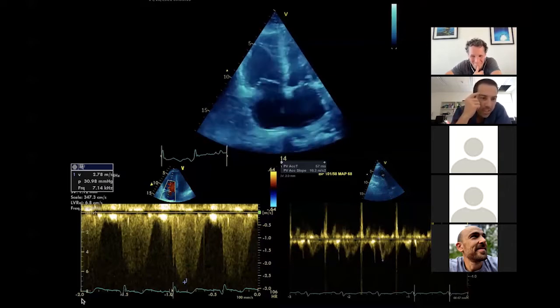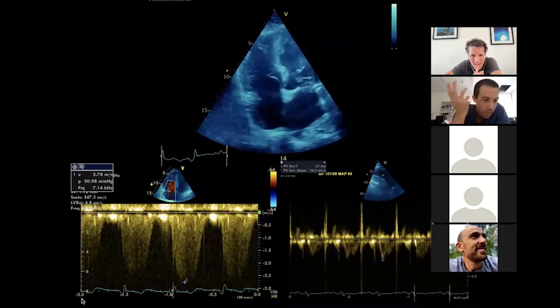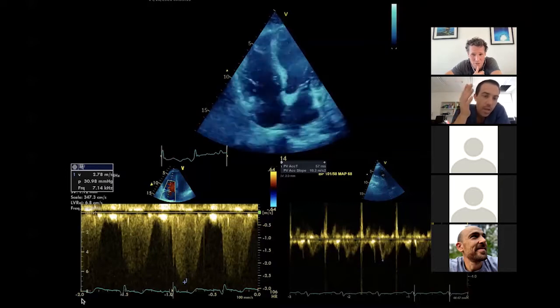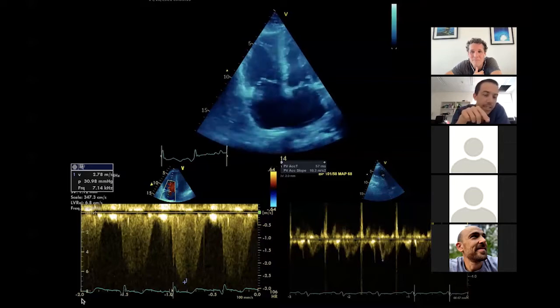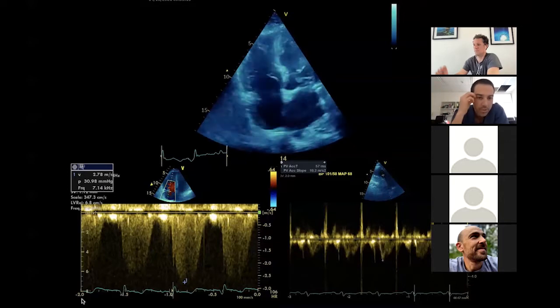The most striking feature is that despite the size of the right ventricle and the impaired RV systolic function on the B mode image, the extent of the tricuspid regurgitation is only 2.78 for the velocity, which is similar to the one before, though, wasn't it? Yeah, exactly. So it hasn't gone up that much. Then it's nothing to worry about. My issue with this reading is that it represents true TR, but the reason it's low is because the RV systolic function is low. So if you can't generate appropriate pressure, then you're going to have reduced TR.